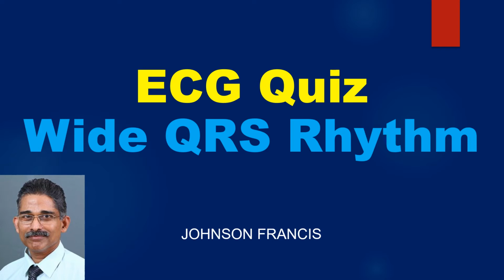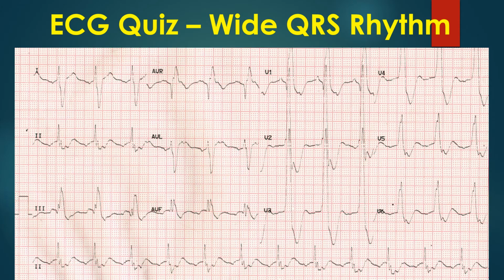ECG quiz on a wide QRS rhythm. Here is an ECG showing a wide QRS rhythm. What are the findings and interpretations?